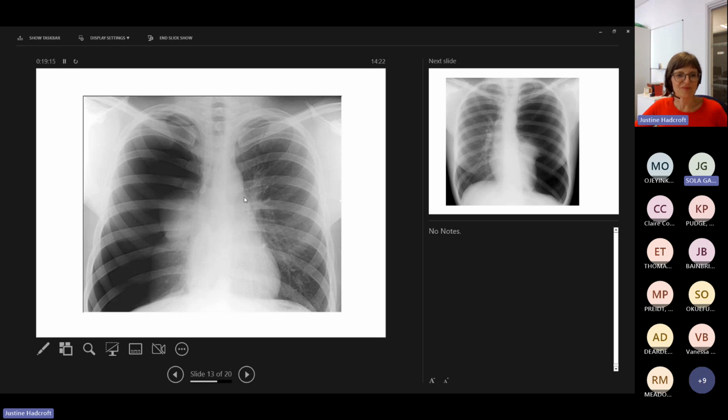And you can see more or less a line. Exactly. So if you look at the left lung and the right lung, it's clearly different. This is really black, isn't it? A bit like the one two goes ago. And can you see this here? Anybody know what that is there? What that funny kind of bumpiness is?